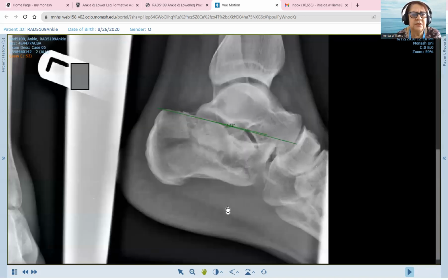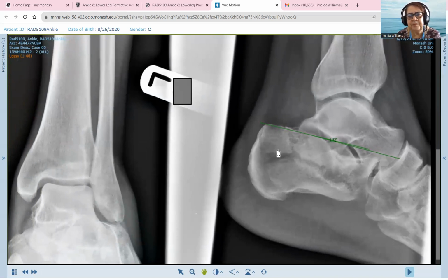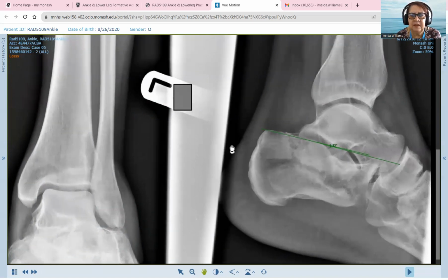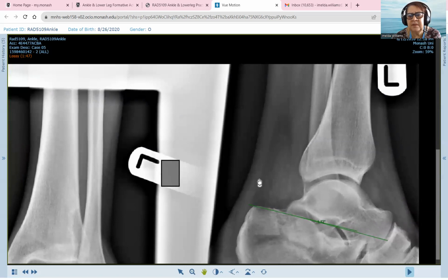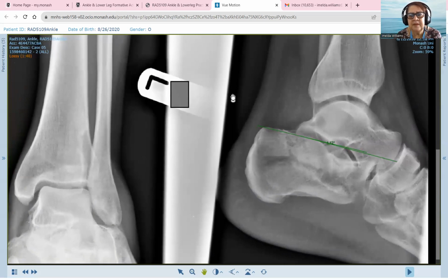So then in terms of the radiographic opinion form that you have, let's just bring those two in again. We can note that the alignment has been slightly affected because there's displacement here. And then also, of course, the bone is affected, the cartilage has been affected. And if we look at Kager's fat pad, there is some displacement there as well. So the overall comment would be that there is an intra-articular comminuted fracture of the calcaneus that goes into the subtalar surface, and there is severe compression of the calcaneus.